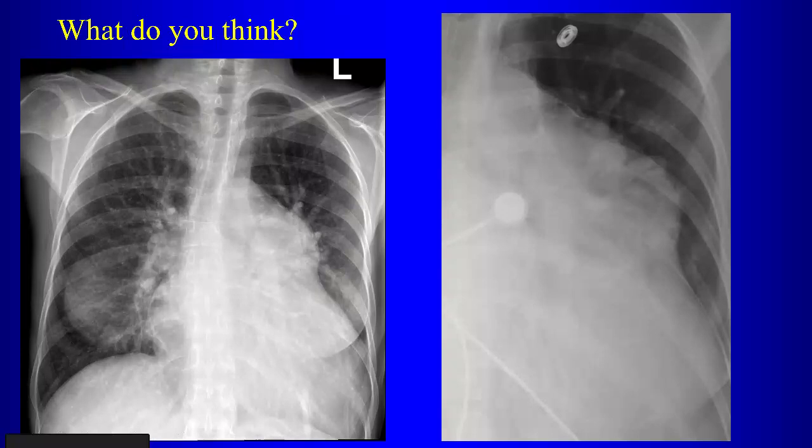Is there any particular vessel that's dilated? The left main pulmonary artery. So the main pulmonary artery here is dilated, right? That bump is the main pulmonary artery. Do you think the right pulmonary artery is big? Yes. You can see all these vessels going all the way up into the lungs, and they're dilated, right? So what do we think this patient has as far as the pulmonary vascularity goes? With big centralized pulmonary arteries, we're thinking maybe this patient has pulmonary hypertension. Okay. Now, later on we'll go through a more detailed discussion of causes of pulmonary hypertension.